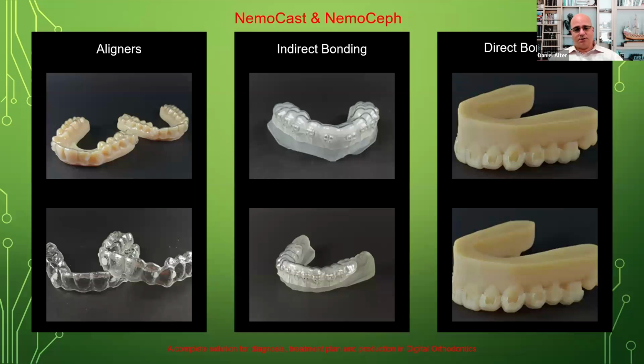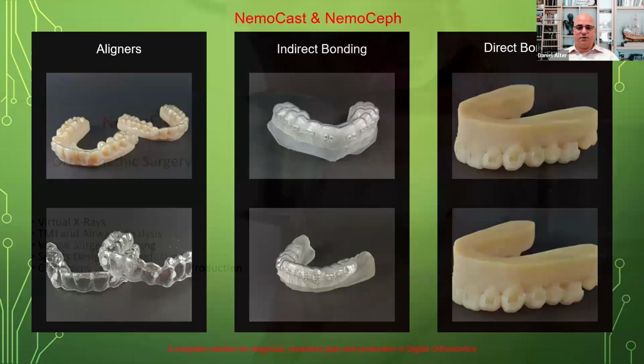So surgical guides is something that we do, which years ago we used to think was complex. It has become significantly easier. Now we've moved into more treatment planning, moving and manipulating the teeth for ortho. But the next step, which I'm really excited about, is the Nemofab, which is the maxillofacial. But if you're not in the orthodontic space or looking to get into it, this is a perfect scenario where you can learn the software and 3D print the models or what have you. Now they're 3D printing aligners as well, all the way to the trays as you see here.